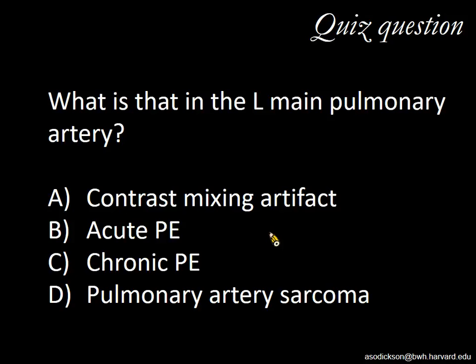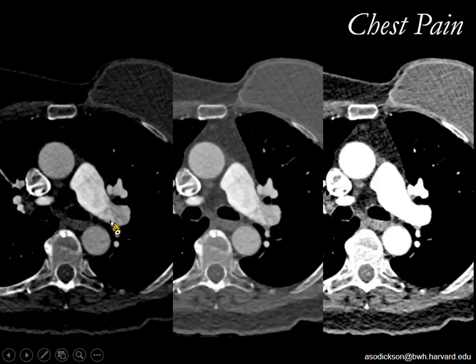Okay, we have, great, contrast mixing artifact as the most common possibility there. Let's switch back to my slides, please. This is indeed contrast mixing artifact. The key to this depends very much on your window level. So I had narrowed this to a rather narrow window here.